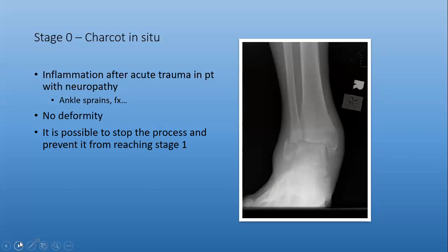Okay. In regards to the fragment on the fibula, it seems to be well aligned, but the proximal aspect of the fibula is now shifted into the lateral gutter of the ankle joint and closing the tib-fib gap, making the clear space more narrow than it should be anatomically. Okay, good.